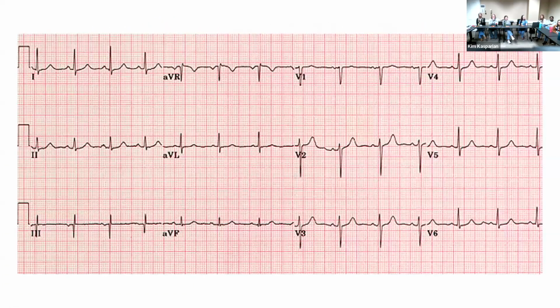All right, so our first EKG. Does that look good? All right. Who wants to read the EKG? Treva, calling on you.